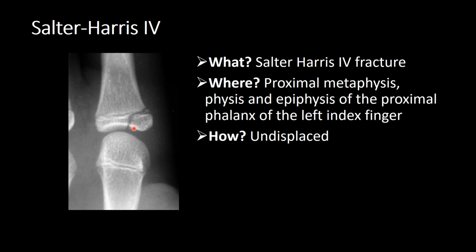And consequently when you go round the epiphysis, again you can see that there is no displacement. Here's the anterior rim of the epiphysis. We're just seeing it slightly obliqued there. So the sclerotic rim is the anterior cortex, and we can see how there is absolutely no displacement between the two fracture sites. So this is an undisplaced fracture.